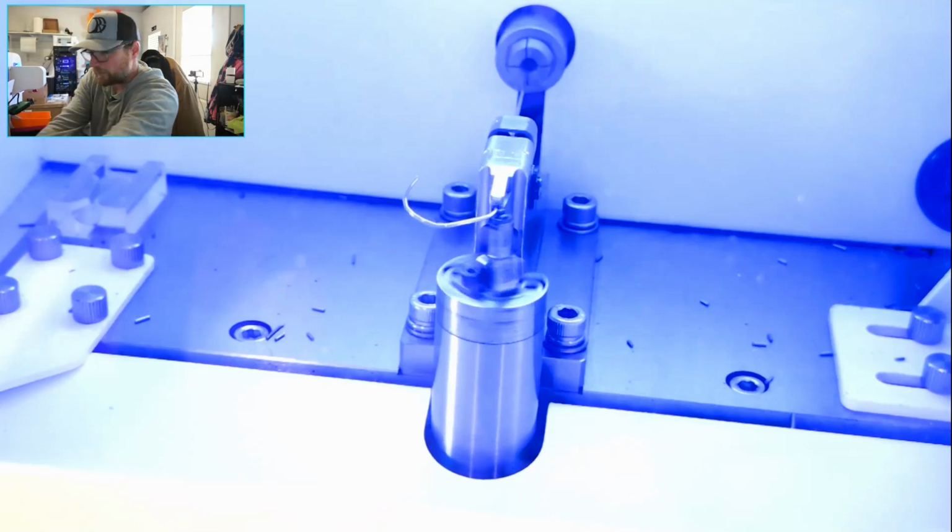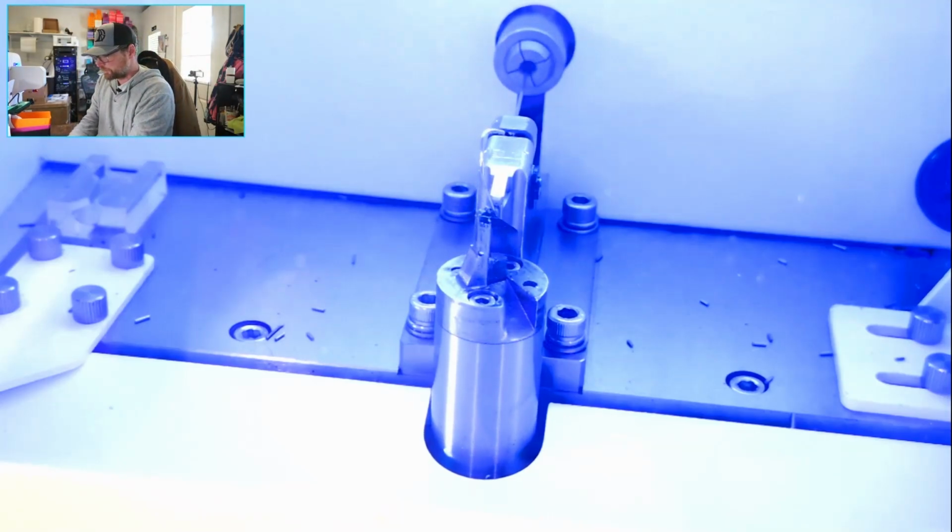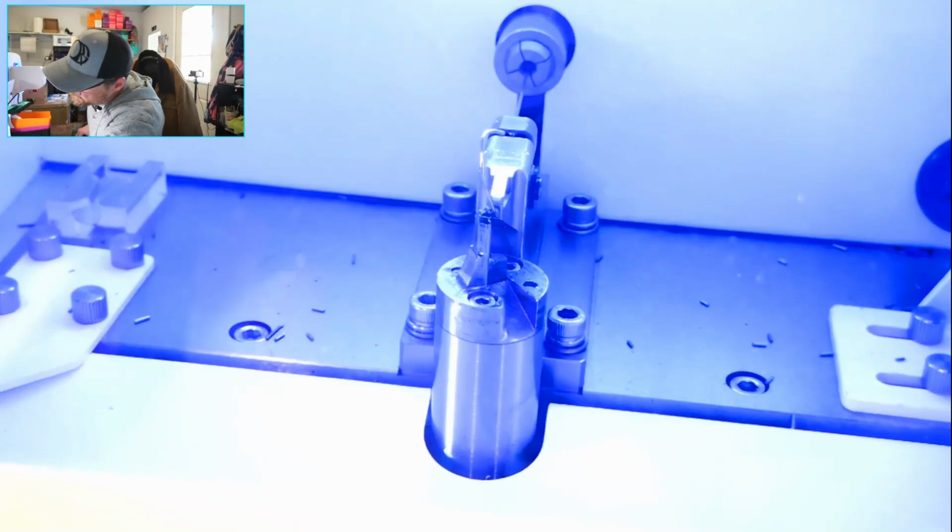I'm getting my white paper set up while that's bending. Again, you can probably, I don't know if you can close it or not, but ooh, I touched the cord. Shoot. Okay, hold on. I think I might have turned off the bender while I was turning on the light and stuff.